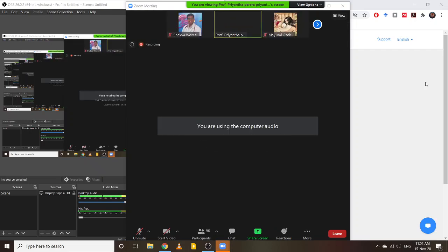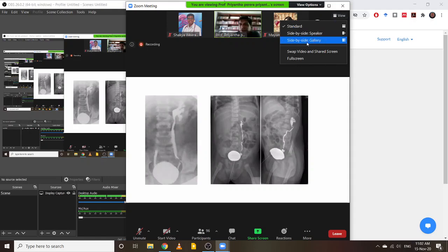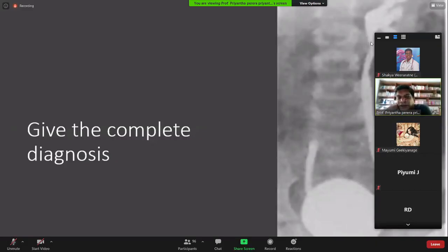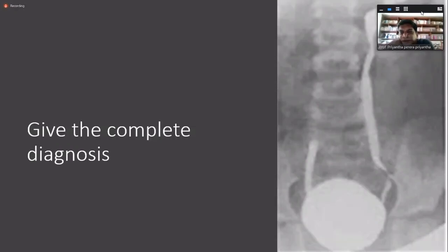This is also an MCUG, right? Right, this is an MCUG. Give the complete diagnosis. Sonali, the mic is with you. Sonali, can you give the complete diagnosis?